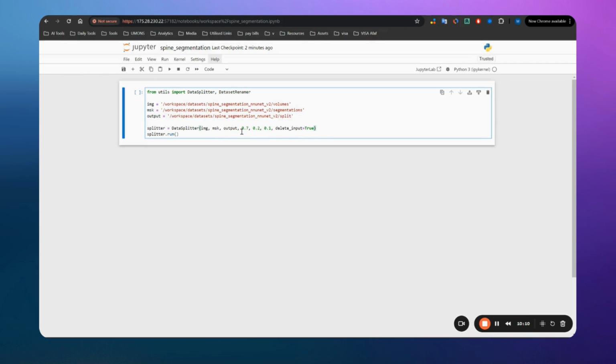Okay, so I'm creating the split 0.7, 0.2, 0.1. This is just my choice, this is not something general. This is the training, this is validation, and this is the testing. The training data will be used for the training, and parts from it will be used for the validation. This part, which we are classifying as validation, we will use for testing, and this one we can leave as just a small portion at the end, if we need it for something else, like just testing our product.